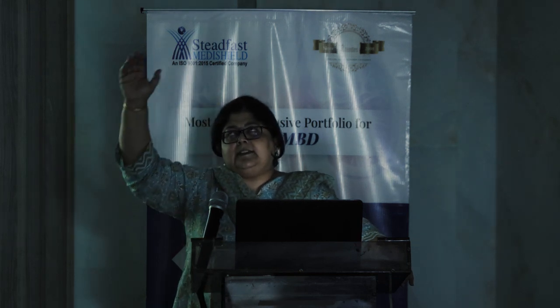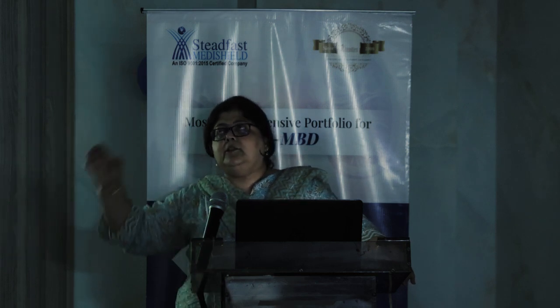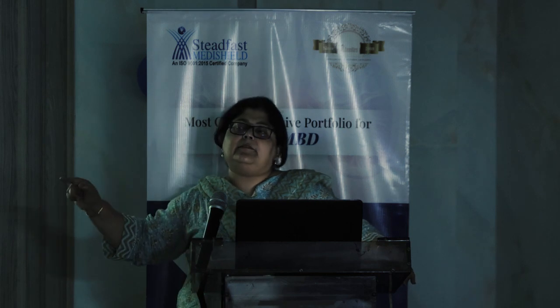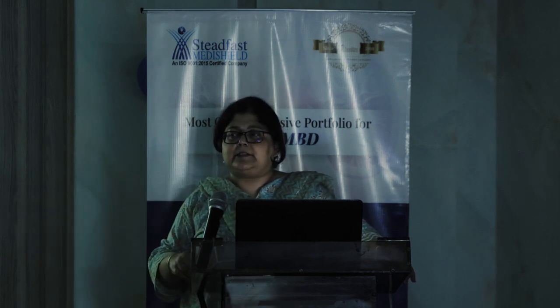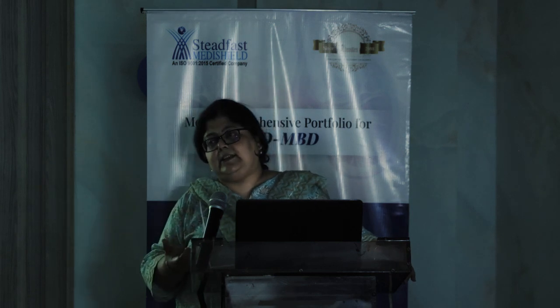Once it becomes a chronic pyelonephritis, or once the kidney has got scarred, then there will be a loss of cortical volume. So there will be a flattening of the contour. Instead of seeing the outline of the kidney as a regular smooth contour, you will see a flattening usually at the poles, or a peripheral wedge-shaped defect in the interpolar region. Once you see those sharp defects, then you know that this is a scarred kidney.